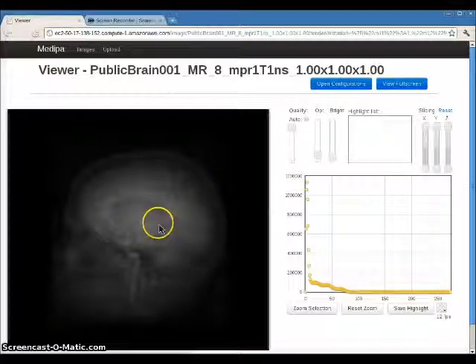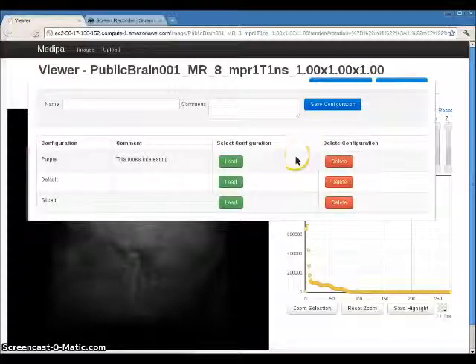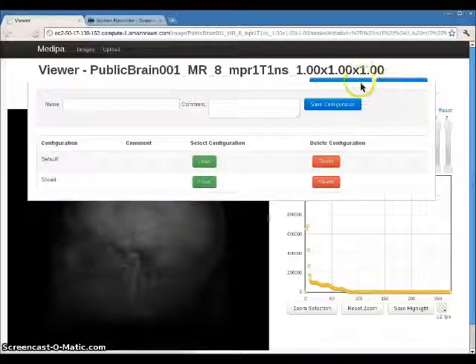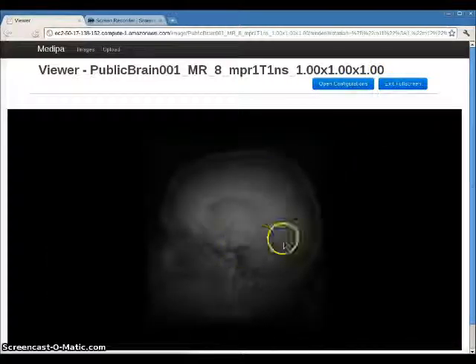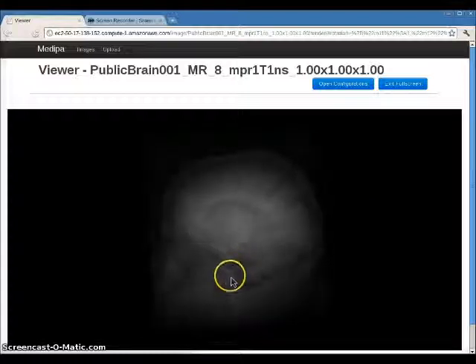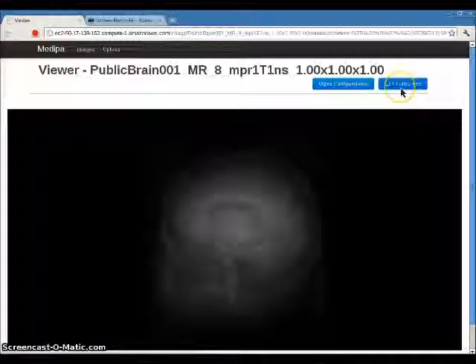So this really allows you to point out things that are interesting and saves a lot of time if you're going back in. And similar to saving, we allow you to delete. So we'll just delete that one I just created. And lastly, the full screen just simply allows you to view the image in full screen. If you don't really want the controls, you just kind of want to examine what you highlighted.